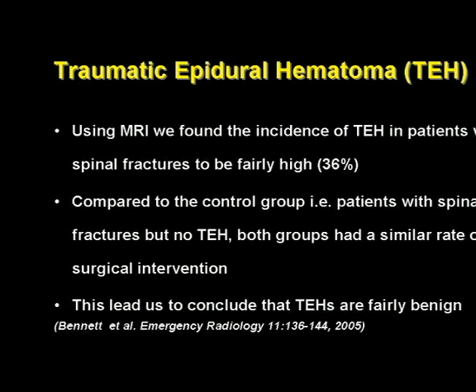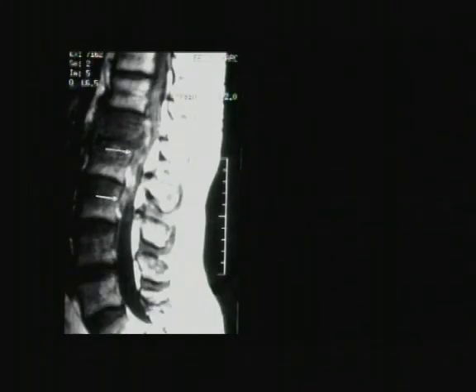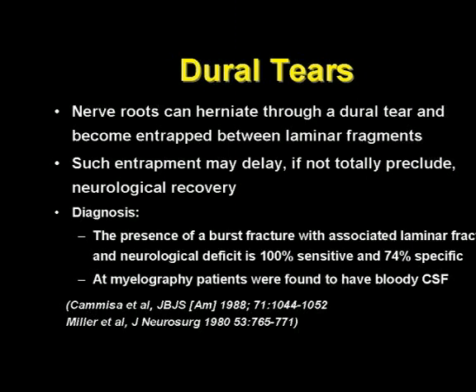We don't think that they are a symptom-producing entity. Although they can produce some symptoms, they're not as serious as the literature usually indicated. And this is such a patient here who has a burst fracture. And you can see here the epidural hematoma and the epidural hematoma here.